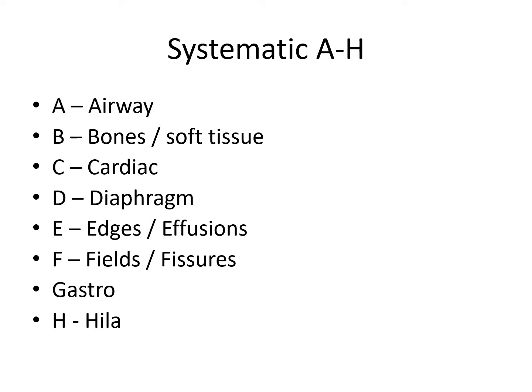C, we're looking at cardiac, so the clarity of the heart border, looking at the cardiophrenic and costophrenic angles and the sharpness of those angles. D, we're looking at the diaphragm, so the hemidiaphragms. These are normally equal, so at the same level.